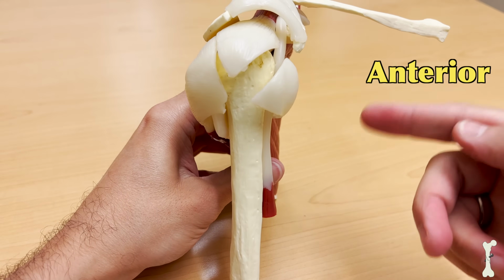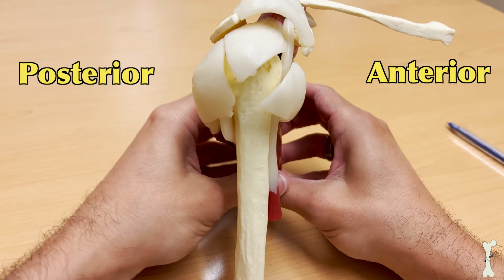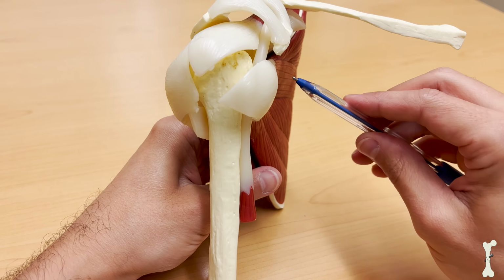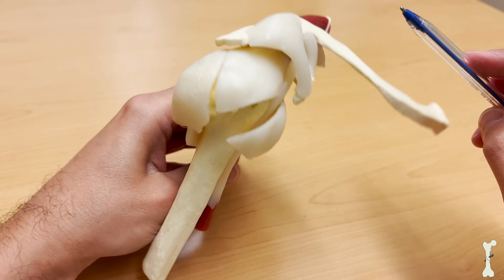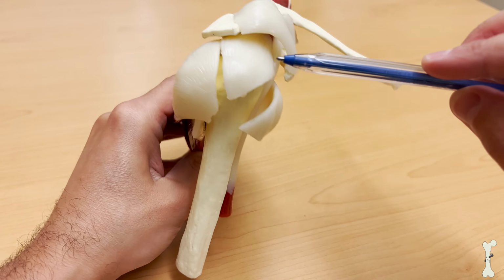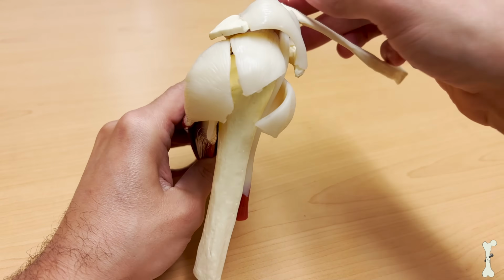So this is the front of the shoulder, the anterior part of the shoulder, and this is the posterior aspect of the shoulder. The subscapularis is the muscle here in the front, and then the tendon extends out towards our camera right here. The supraspinatus attaches along the top of the shoulder blade and runs back out towards us, towards the camera, and attaches up in this location.